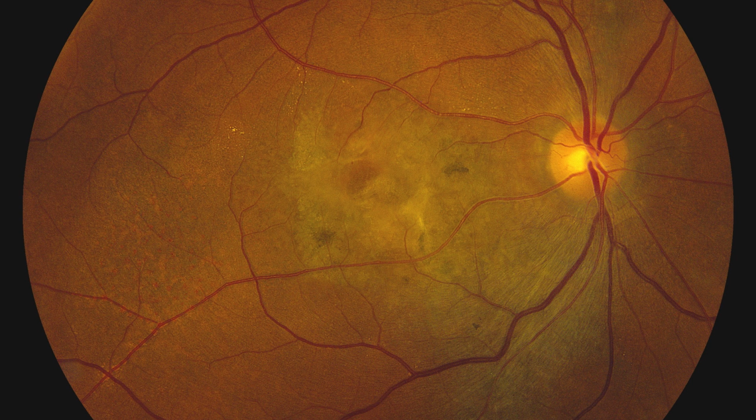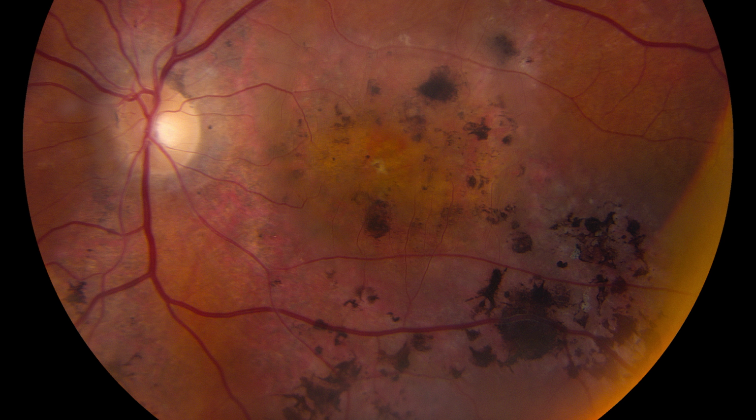This patient has diffuse subretinal fibrosis, as well as some RPE metaplasia, some RPE mottling in the temporal macula. The patient's fellow eye, the pseudophakic, showed even more extensive RPE changes, as well as you can see this shadowing of the blood vessels, particularly that arterial just above the fovea, and that appears to be consistent with either subretinal or intraretinal fluid, and I'll show you the OCT later in this lecture.